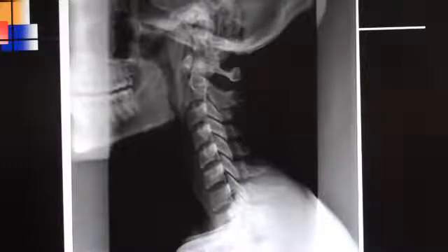All right, so if we continue on looking on the film, we can see the auricle portion of the ear right here, and so that's that sort of rainbow shape right there. We can see the auditory meatus right here, this little dark hole. We see this rounded structure right here, which happens to be the mastoid process. And we, of course, then, if we start with the spinal structures, we see the anterior tubercle right here.